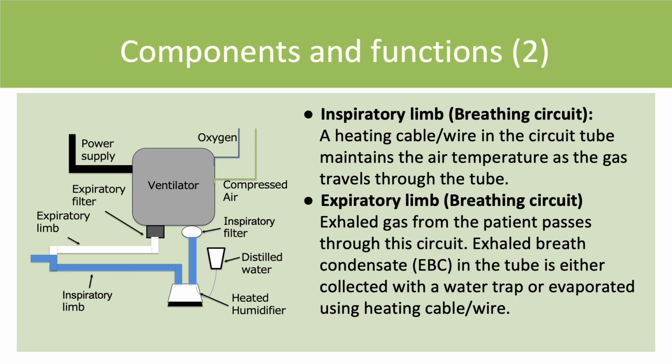Since the exhaled air from the patient is heated and humidified, condensation tends to accumulate in the circuit, so a water trap is placed in the circuit or a heater wire is used like the inspiratory limb to remove the moisture.